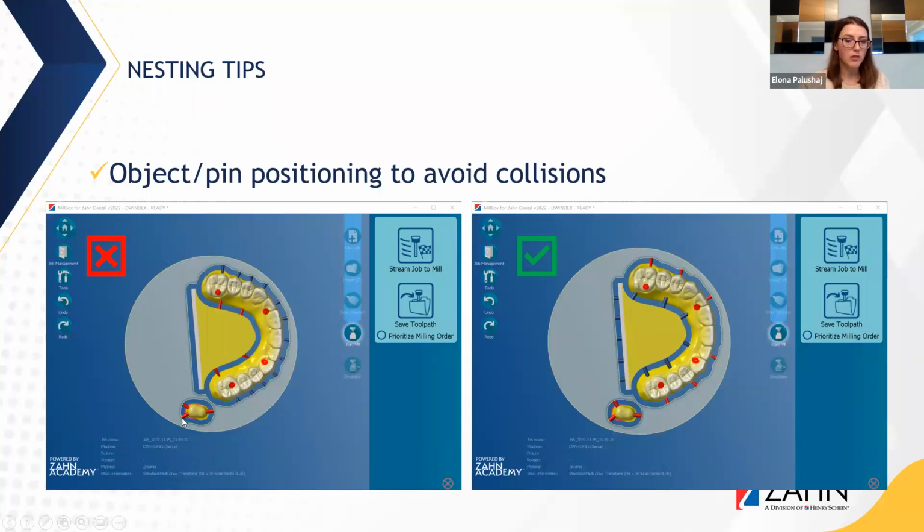Also, when you're adding pins to even single units, adding those pins really close to each other, like on the left, will cause the tool to be trapped in between those. So try to position them as far as they can be, basically. Understand we want to make sure we don't use the contact areas for pins, but try and position them as far as possible.